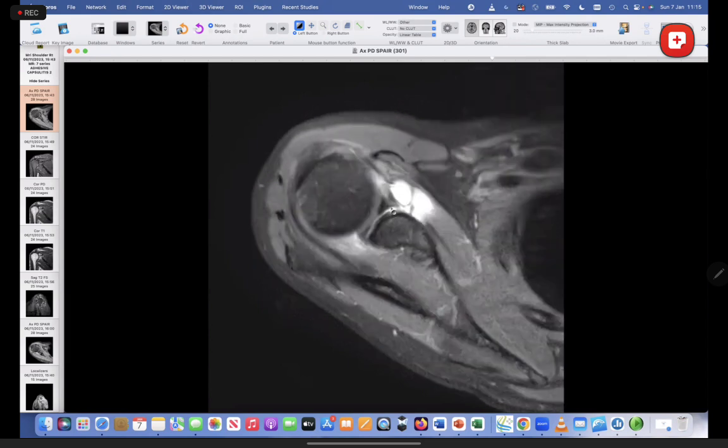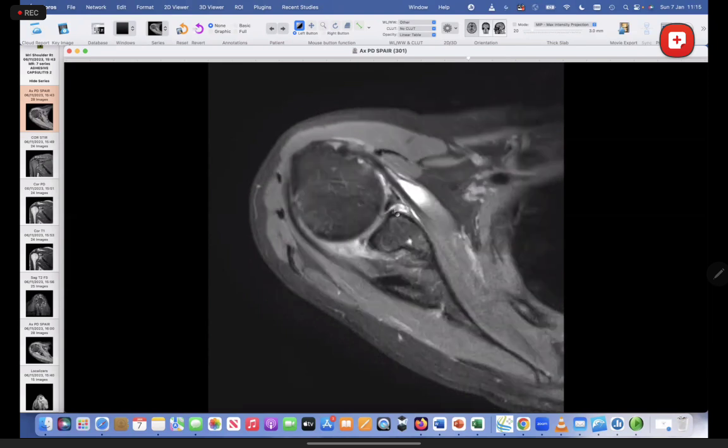So immediately I can have a look at the anterior superior labrum. I know there is a problem and there is a cyst, which means this can mimic what? This can mimic rotator cuff symptoms. In other words, if somebody's got a supraspinatus problem or an anterior superior labral problem, they'll present clinically the same way. So that's why it's important for you to know what is causing what. But they can present clinically the same way. So you can see a cyst coming here. So that's the labral cyst.